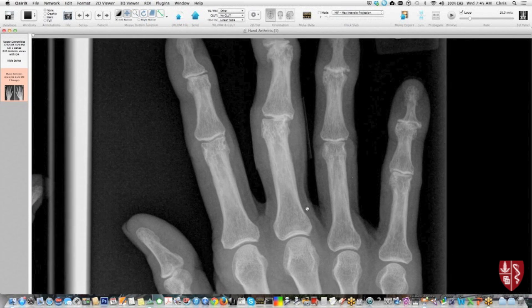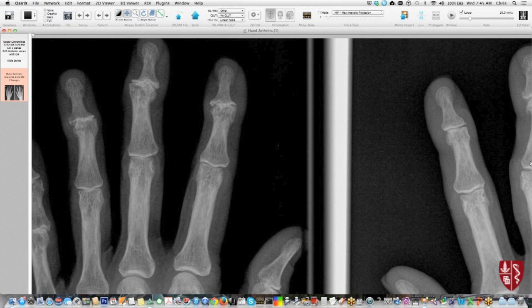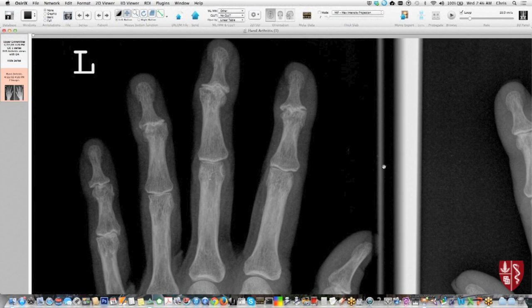As you go more distally, you start to see some abnormalities, right? This second digit is fairly normal here. This DIP joint starts to show some narrowing and small osteophytes, and these are more advanced here and here. So we should know that when you're looking at arthritis, if it's more distal involvement without erosions, like in this, that's a pretty classic appearance for just osteoarthritis involving the hand. That may be asymmetric in patients because of hand dominance. In this particular patient, it's fairly symmetric.